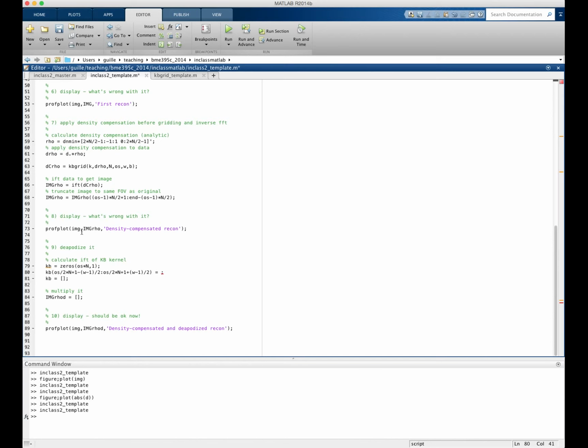This is a bit long, but it's going to be 1 over w times the size of the neighborhood times Bessel I 0 comma b times square root of 1 minus, sorry, minus, I should talk and type at the same time, w minus 1 over 2 up to w minus 1 over 2, dot divided by w over 2, close paren, double close paren, squared, close the square root paren, close the Bessel I paren.